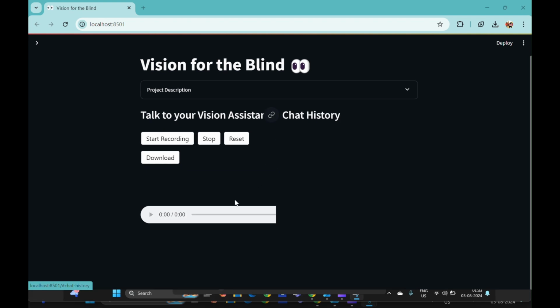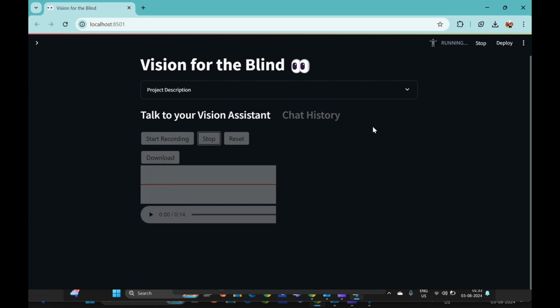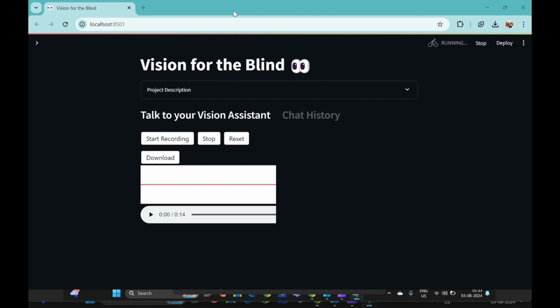Okay, so now let's start by asking the question. Okay, so I'm really tired and I am looking for a cab. So are there any cabs around me, and please tell me the way to it. Okay, so I've asked my question. We'll get the answer in the same way as we've seen before. So I'll just skip through this until the model responds, and then I'll play the video from there.